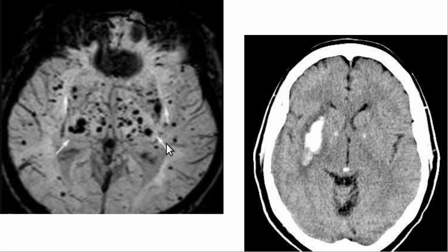And what I'm going to tell you right now is actually a rather profound statement, so this is worth listening to. I know some of this was just jargon that you really didn't care about, but here's something that you're going to care about. With hypertension, you typically get the microbleeds centrally. Really high pressure causes these little microbleeds centrally. Now, these peripheral microbleeds are thought more often due to a type of dementia called cerebral amyloid angiopathy, which is thought to occur in association with Alzheimer's disease.